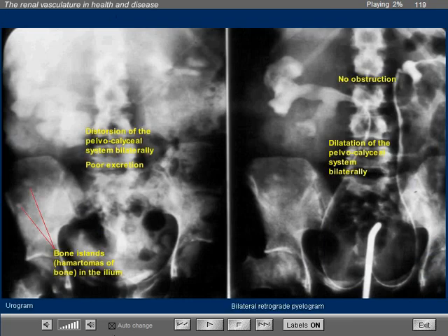This is my first case of angiomyolipoma studied several decades ago of a lady who was operated in Texas, and they made the erroneous diagnosis of polycystic disease. She presented with renal failure and hypertension, which are features also observed with the polycystic disease. Note the picture to your left, a urogram where we can see poor excretion of the contrast material and marked distortion of the pelvocalyceal system. It almost looks like bilateral hydronephrosis.